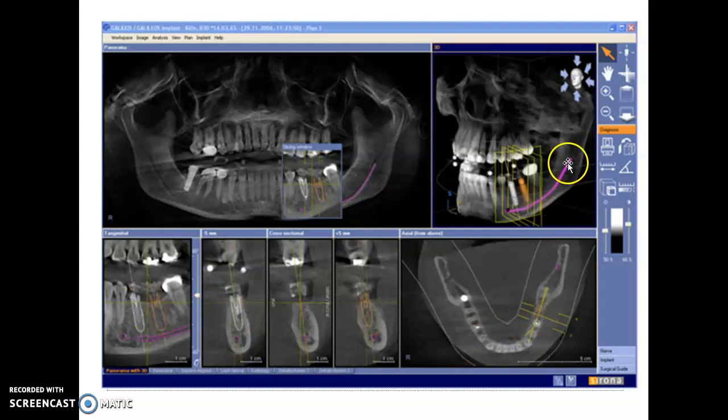Okay, you can see the representation of that mandibular canal. One of their concerns must be that the implants would interfere with the mandibular canal. So you can see the mandibular canal here. You can see it just a little bit in this image. You can see it come all the way through these other images. Okay, but you can see there's also an implant on the other side, and you can see it present here.